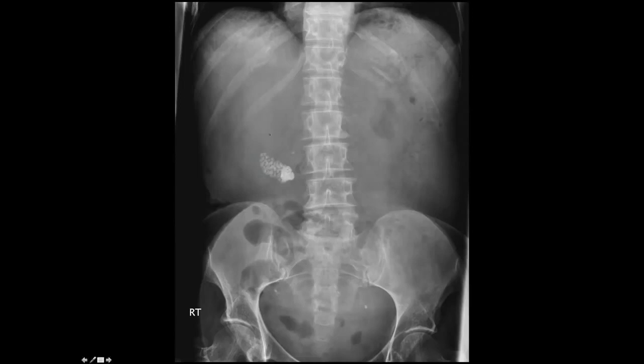Yeah. So that might be in the cystic duct or in the CBD, and maybe this gallbladder is thickened in the correct clinical setting, and you need to take it further by doing ultrasound or CT scan. Having said that, the gallstones are only opaque in about 10% of cases. Is that correct? I think it's about, that's right, 10 to 15%. Okay, yeah. So ultrasound's a better way of looking at gallstones, but your point's made about the opacities. Absolutely. That's right. And again, this is not abnormal in itself just to spot this, but in the correct clinical setting and findings, it will be significant.